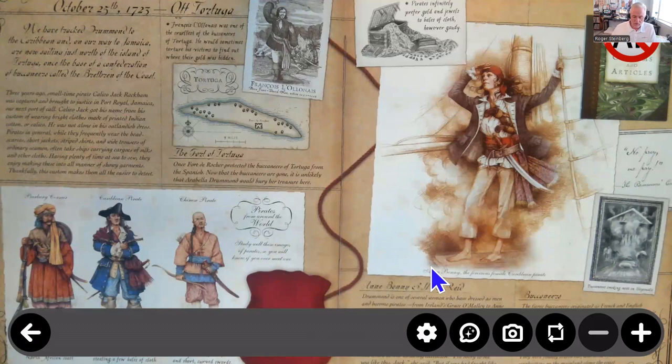At the bottom of the screen, you can see that in the magnifier, a toolbar presents. You may remember a few moments ago when I was in interface options, the default was set to auto, and I set it to be always. And basically what this means is that this toolbar will persist at all times now. For a demonstration, I like to have it there all the time so that you can see all the tools that are available. In auto mode, it means after a few seconds, it would sync to the bottom with a tab in the middle that you would click on to bring it back up. So it would go up and down after a few moments to give you the full view of your screen. But in demos, I like to keep it on so you can see all the tools that are available.